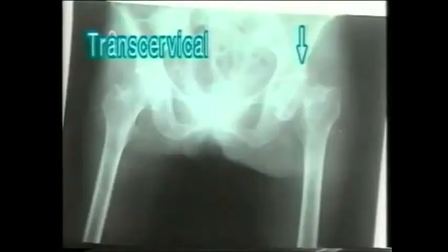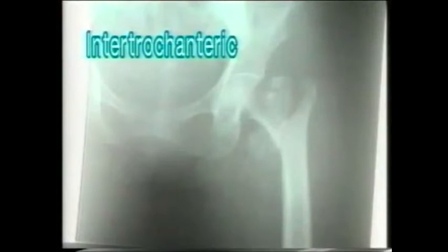This is a fracture of the neck of the left femur. It is transcervical, not involving the trochanters. This is an intertrochanteric type of fracture of the neck of left femur. Note the fractured trochanters.